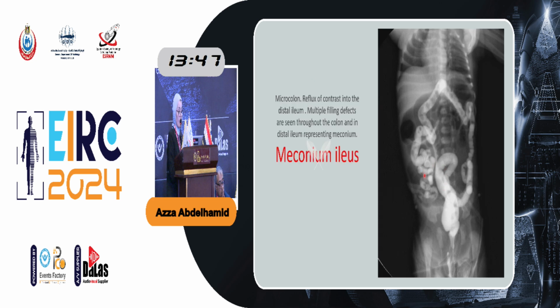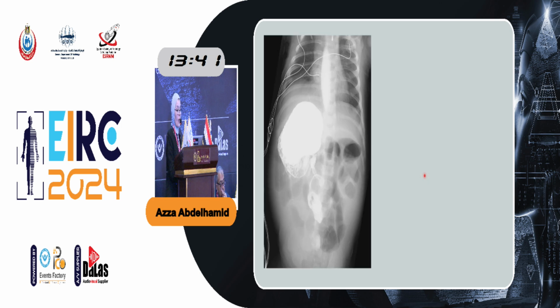So this was a case of meconium ileus, and of course it might be associated with cystic fibrosis. In that case, this is a case of midgut volvulus, with bilious vomiting.